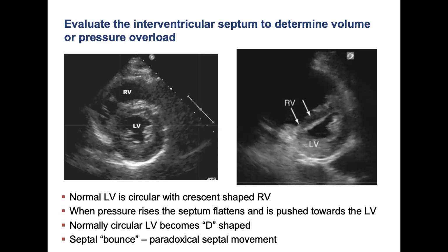Of course, it's usually not all of systole, so you might start to see what a lot of people refer to as a septal bounce, where you see that flattening during either part of systole or only during diastole, and that's that increase in the right ventricular pressure.